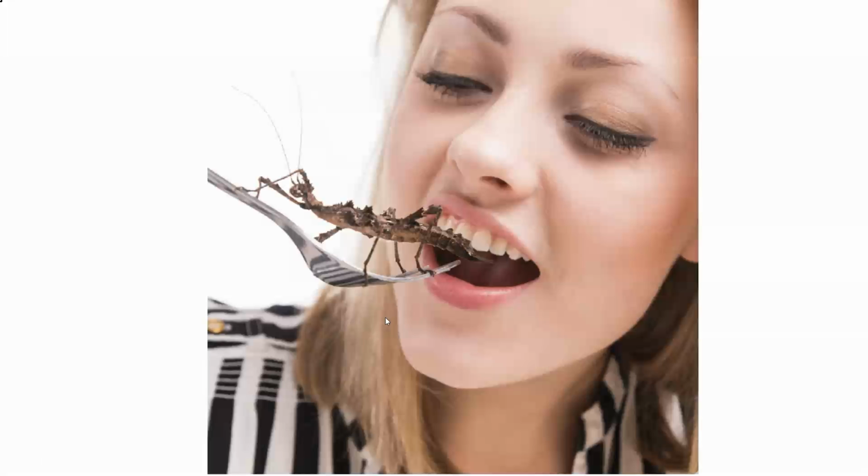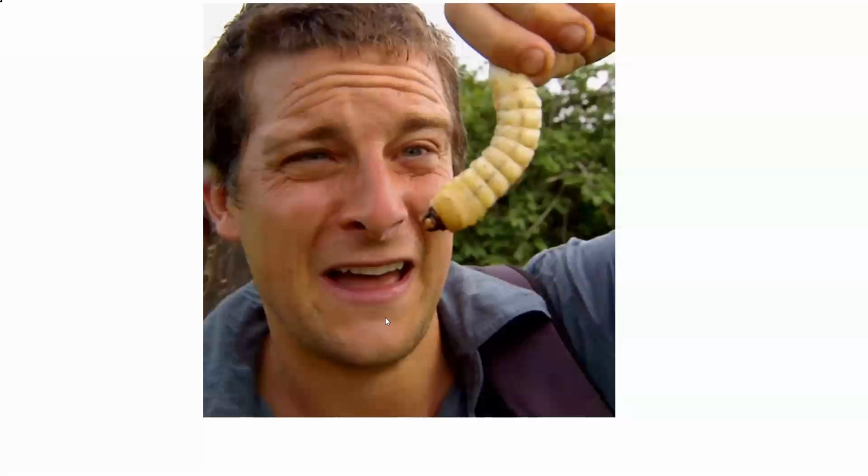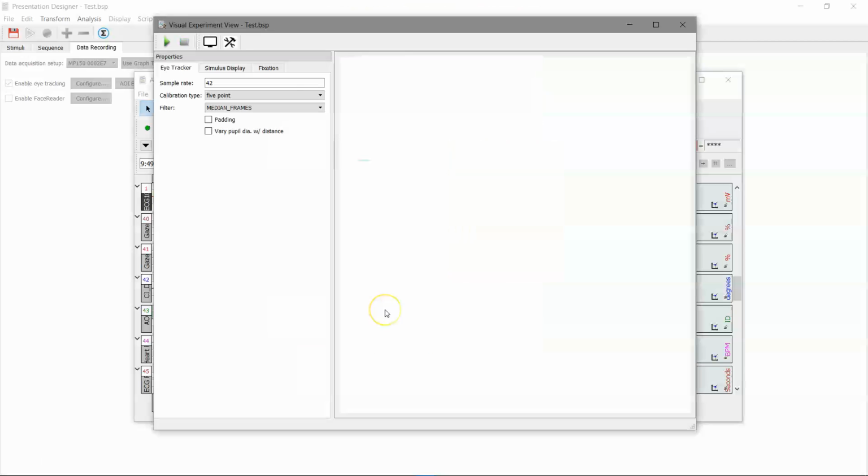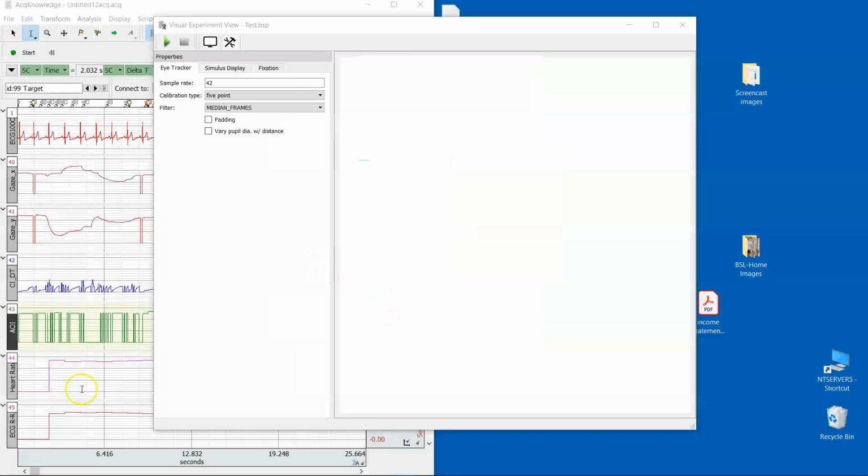Now, if you remember, if I dwelt over the target, the focus cross, it will advance on rather than waiting for the 3 seconds. And then the images are set for 7 seconds. Okay, so I'm going to conclude this screencast at this point.